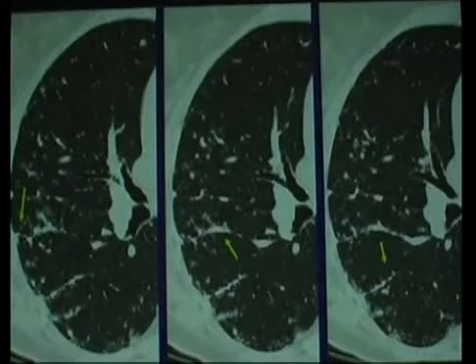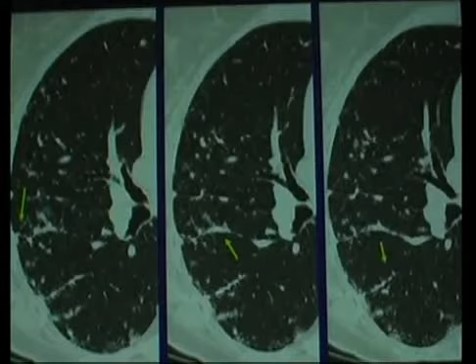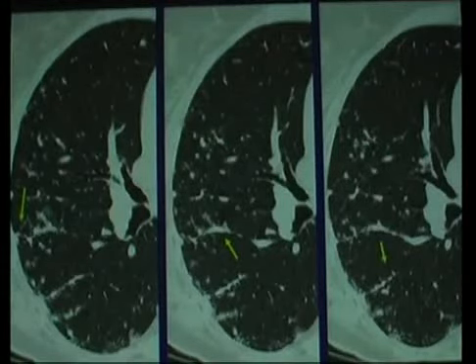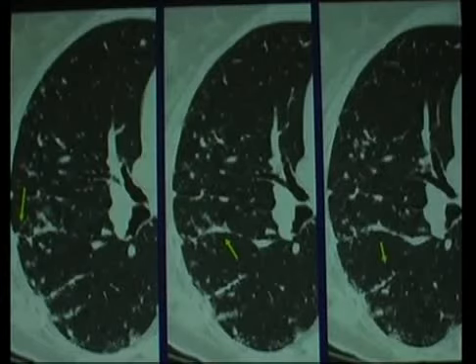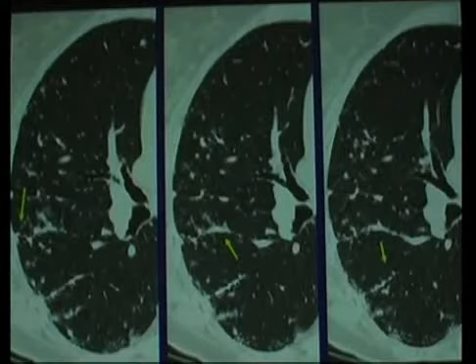So, a couple of examples. What's the predominant problem here? I just showed you a whole bunch of cases with reticulation and honeycombing. That's not what's happening here. What's happening here are there are nodules all over the place, and they are clearly involving the pleural surfaces, right? They're also involving these central airways. Look at this bronchus and along its wall. Look at this bronchus down here and along its wall. Look at these vessels, and you can see they're literally beaded. Why are they beaded?